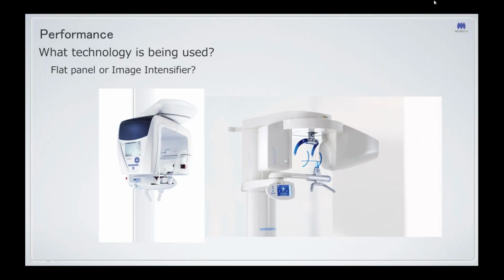An image intensifier machine is, say, the one on the right of your screen. So this is one that has a very large detector here, which filters down to a very small detector down here at the end of this cone. Okay, this is old technology, and this is something that all manufacturers have been phasing out over time.